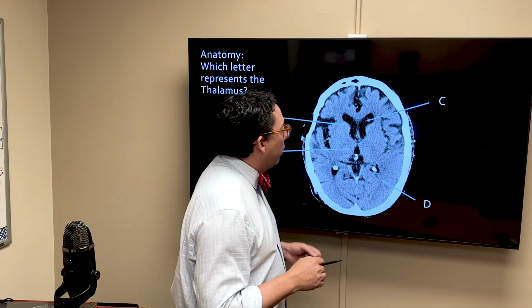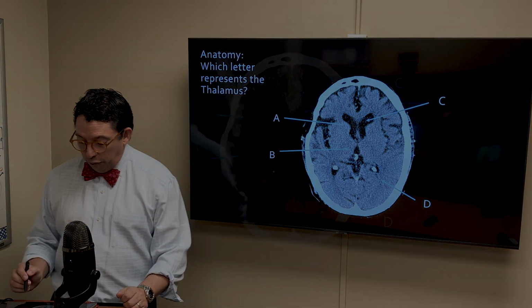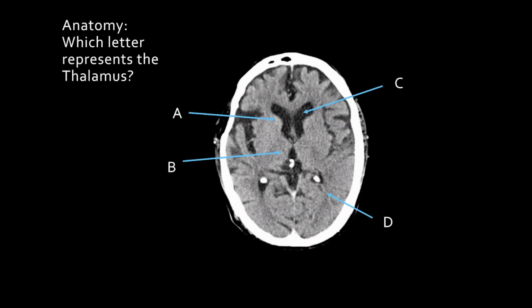The gray and the white matter are slightly different. If you look carefully, you're going to see that there are structures like this one here that is slightly denser than this region that I'm going to show right there, making the structure that I showed last slightly darker, and that is going to be the white matter.